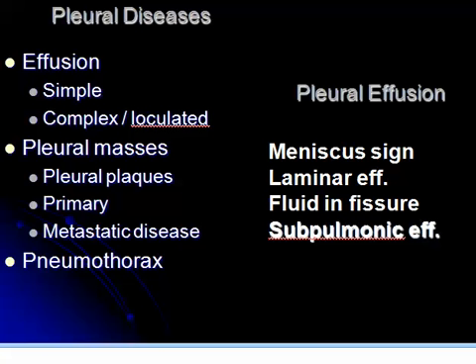Pleural effusion may present as meniscus sign or laminar effusion or fluid in the fissure or subpulmonic effusion, which might need a CT or simply lateral decubitus film can do.